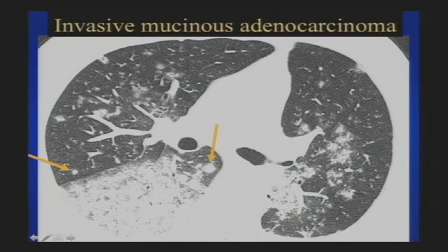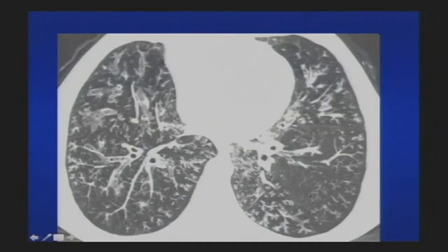Another finding which is very, very helpful in clinical practice is this finding, which Rick touched on briefly. This is a beautiful example of it. We see these branching, tubular, soft tissue attenuation things with nodules sort of along the courses of them. Notice how they are centrilobular. How do I know? Because they are away from the subpleural surface. And in this case, we can see how these connect to more of the central airways. We can follow them back to these more central airways. This is a nice example of both small and large airways disease in the same person.